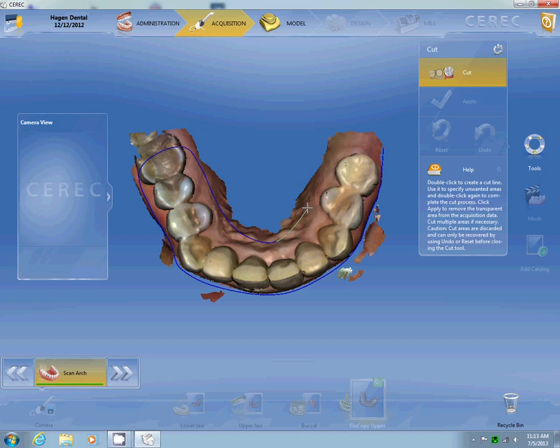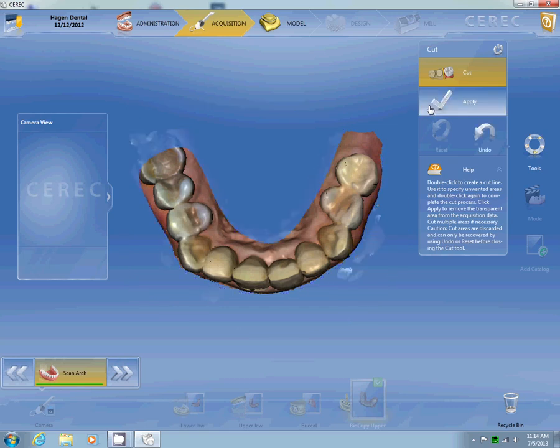We're going to make this model look nice and tight, and then we're just going to flip all the way around so that the stuff that we want to remove is inside the circle. I like to do it in one if I can. Click Apply, close this down.